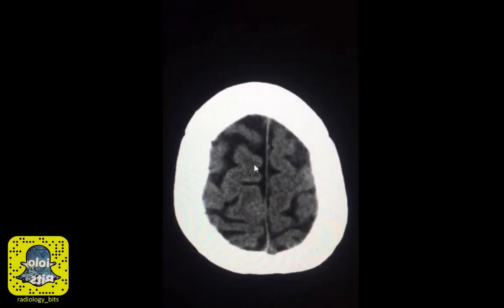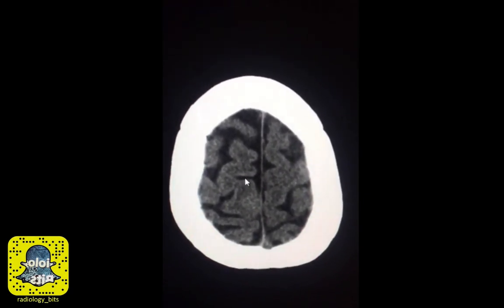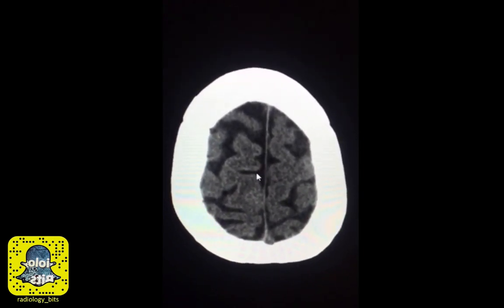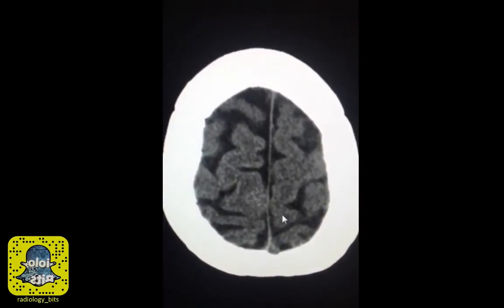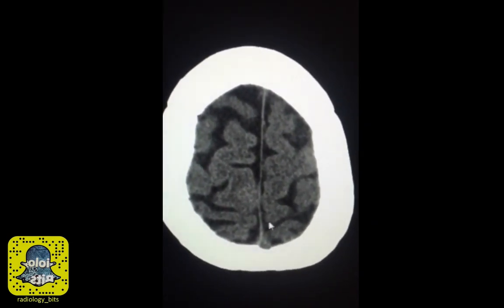We've talked before about how the surface of the brain is undulating, with these being gyri and these being sulci. Since a deep sulcus contains CSF fluid, which appears dark here, comparing the sulci on each side would be a useful thing to do on this case. And if you do that here, you'll notice that you have abundance of dark sulci with CSF, except for this region.